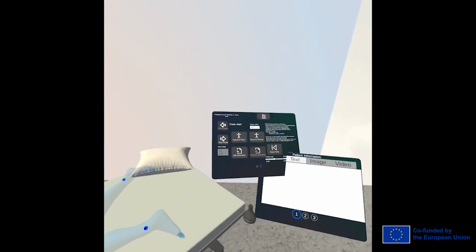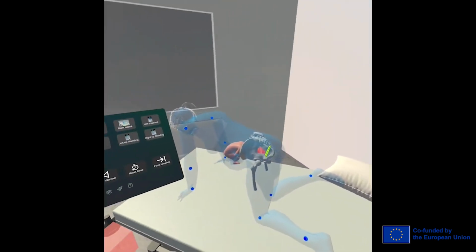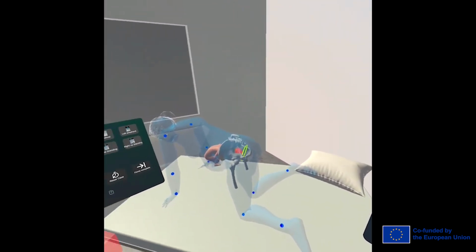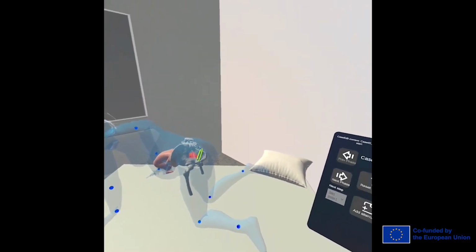So it's very easy. You can reset it right here. Reset. And the baby is back to the base position. I can do the same for the woman, but I do not want to because let's say I like the current position, which would be the starting position.